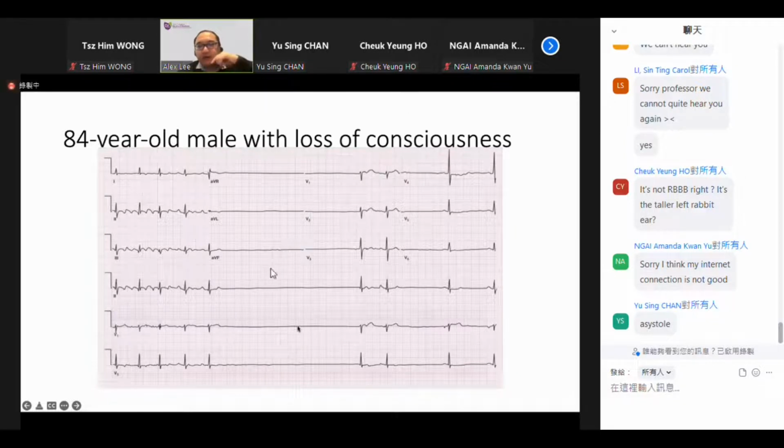And this is something you will see in a patient with sick sinus syndrome. And you see here that it is an atrial flutter in the very beginning. And then actually the last two bits here is a sinus rhythm. You see here there's a P wave, there's another P wave. So there's two sinus beats and then followed by a sinus arrest. There's no sinus rhythm at all, and then no ventricular or junctional escape as well.